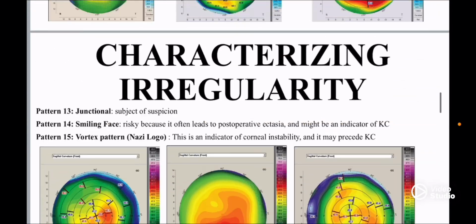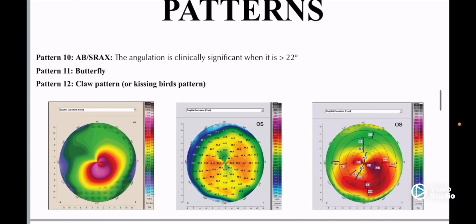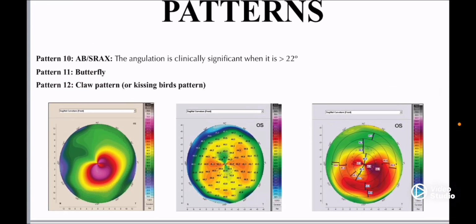Now one catch in this is all the named patterns are always very risky patterns, so they are high risk patterns for any refractive surgery. So these patients must not be taken for refractive surgery in any instance.